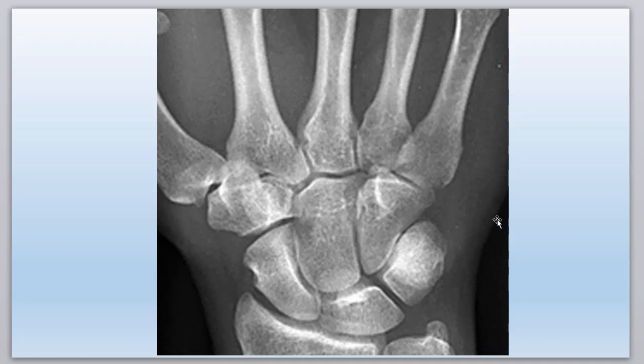Okay, now let's look at the wrist itself. So, which way's lateral, which way's medial? You can see the thumb sticking out here. So that's the first metatarsal here. Shaft, here's the base of the first metatarsal. Remember, these are all bases. Sorry, metacarpal. I'm still thinking of the lower extremities. Metacarpals. These are the bases here down low. These are the shafts of the metacarpals.